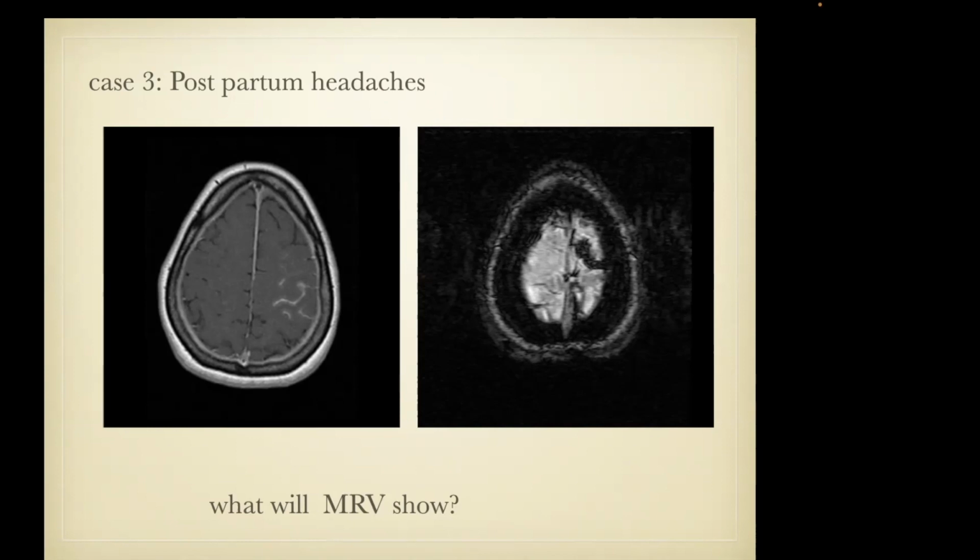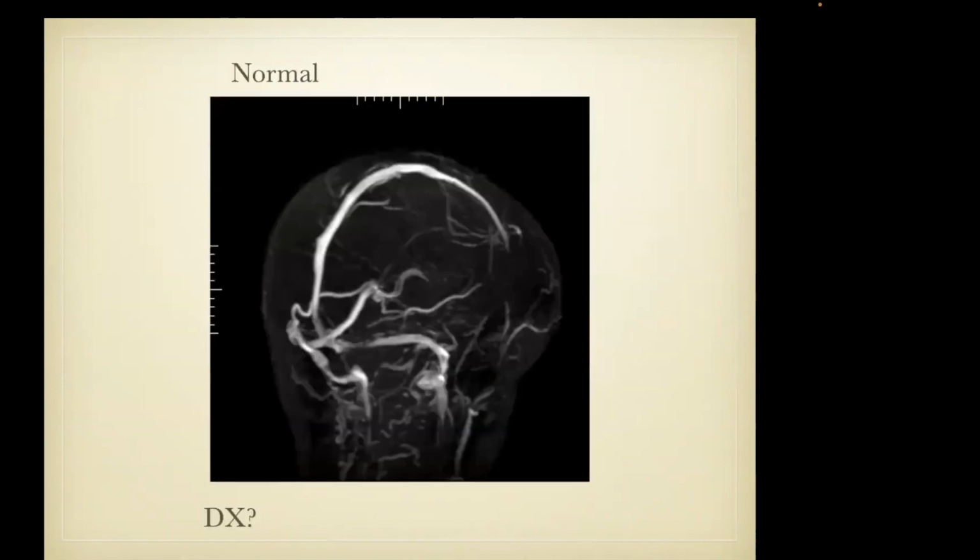And so this is a very important finding to look for. And the problem in these cases is that this is the MR venogram in that patient. Now, why is the MR venogram so unhelpful? Because when you have isolated cortical vein occlusion, you are missing a cortical vein. But because the cortical veins are variable in their visualization on the coronal imaging and also anatomically, they're not predictable in terms of their location, you can't tell when one's missing. So unless it's a cortical vein and dural sinus thrombosis, the MR or CT venogram are not going to be helpful in that diagnosis.